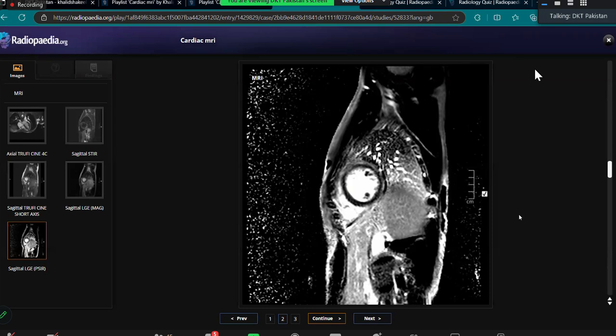If you do not know about it, you refer the case for the opinion of your cardiac specialty doctor. So which is good. Basically, this is an acute setting. We told you that there is an acute rise of cardiac enzymes and things like that. So this is a case of myopericarditis. Okay, there is trace pericardial effusion as well.